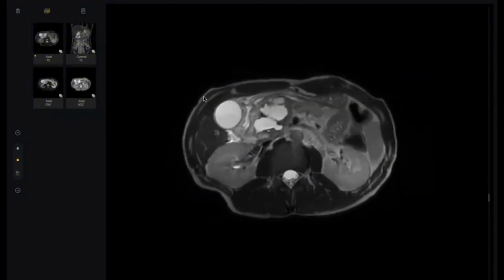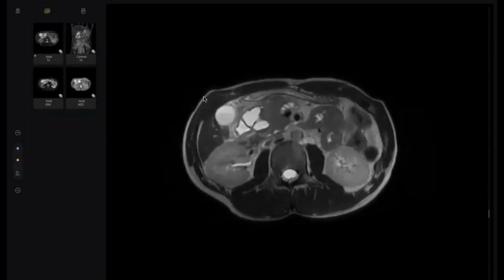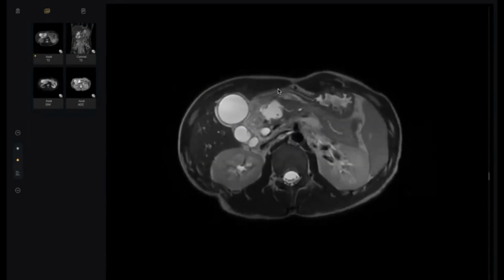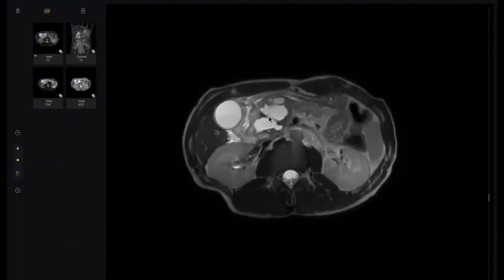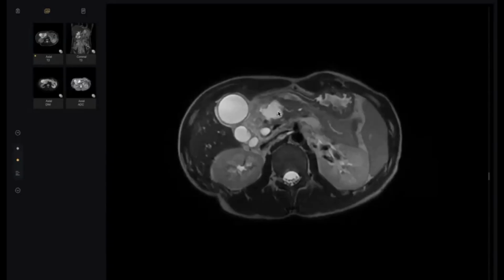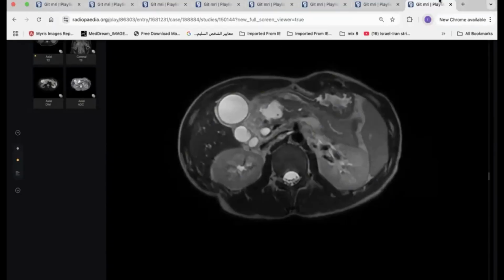It was a post-pancreatic injury pseudocyst formation connected, and this is very important, connected with the main duct. Why? It will change completely the management plan. I think they must repair this area, because the pancreatic duct is oozing here. Whatever the management, we should mention this connection. Thank you, doctor, so much.